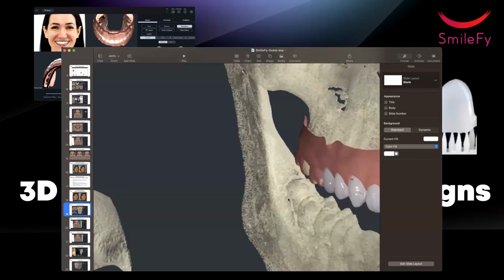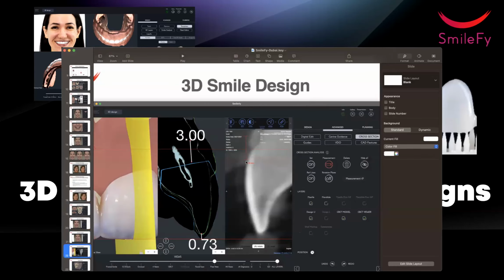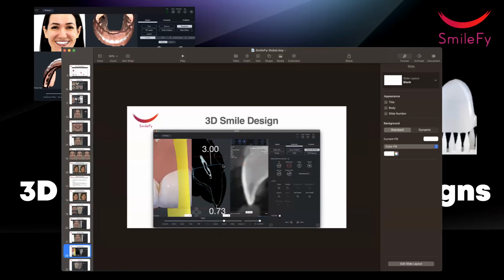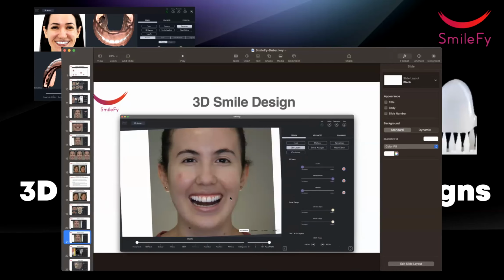You do have the bone margins, you do have the gingival margins, you create the new plan, you measure with the medical viewer, you measure the bone margins, you see where the bone margins are, you create the biological width. You do the gingivectomy, bone grafting, bone reduction, right? Osteoplasty, you create a 3 millimeter biological width, you create a veneer, and then the veneer is this instead of this.